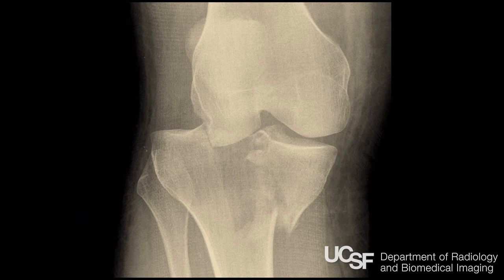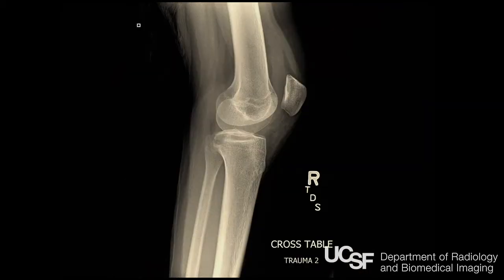1 through 3 are lateral, and then 4 is medial, and then 5 is medial and lateral, and then 6, it's so discombobulated that there's no connection between the diaphysis and the tibial plateau. 4 is worse because you tend to bear more weight on the medial side and you lose the reduction. So that's why it tends to be worse than the lateral ones. Here, cross-table lateral showing a joint effusion.